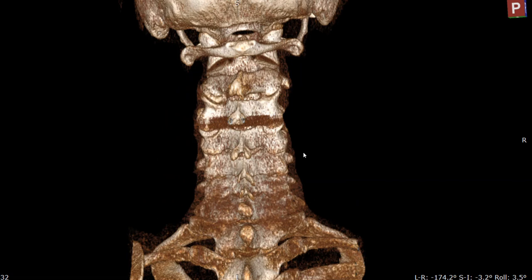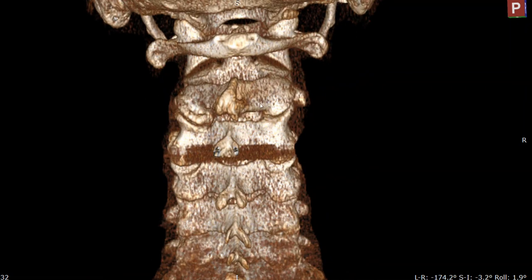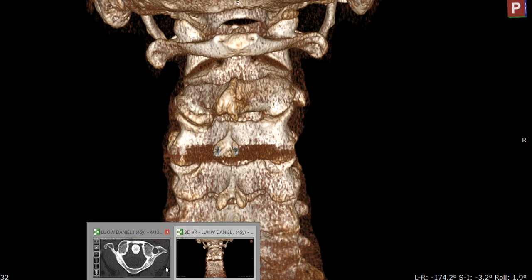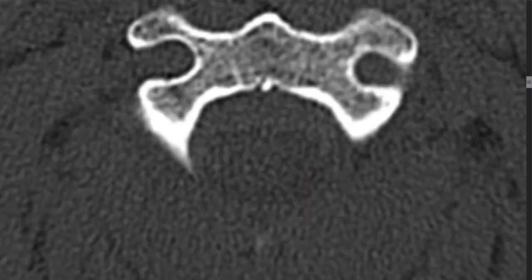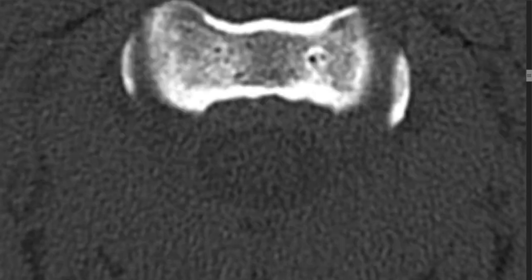Yes, it did. I'm going to pause so I can clean it up. All right, there's probably not going to be too much to talk about here, but you can see there's some degeneration on this facet here. You don't normally use three-dimensional anywhere to diagnose a lot. You use it to know where to look in two-dimensional. So if there's something that rings out here, then I go back to two-dimensional and I come down and start looking, let's say like that was at C2-3.